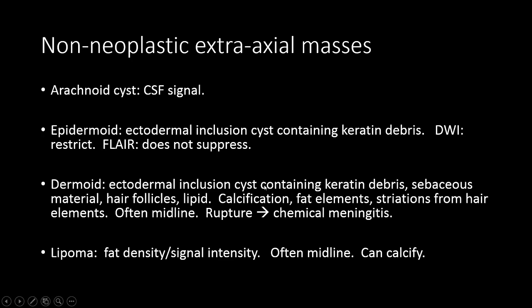We'll next talk about non-neoplastic extraaxial masses. The most common non-neoplastic extraaxial mass is an arachnoid cyst, and really the key thing to know about arachnoid cysts is that they should follow CSF signal on all MRI sequences, and of course on CT they'll follow CSF density.